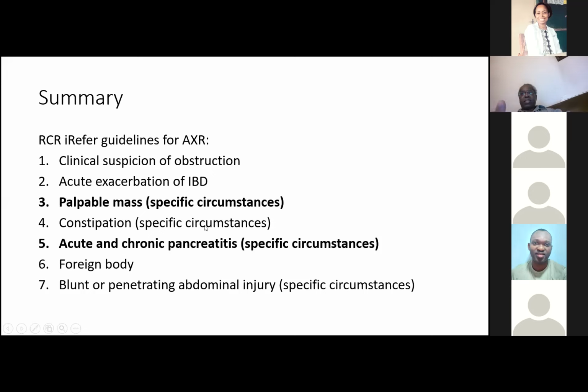So I think that in this case, and I think Dr. Chasi might say, I love CT scans, but in this scenario, in both cases, I'm happy with a plain X-ray to take them to theatre. It depends obviously on the clinical setting, but they don't need any other thing, because what we're worried about is a perforation.